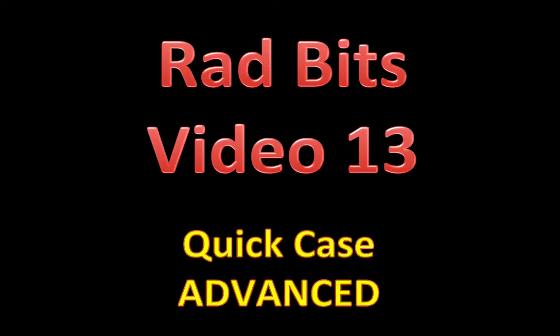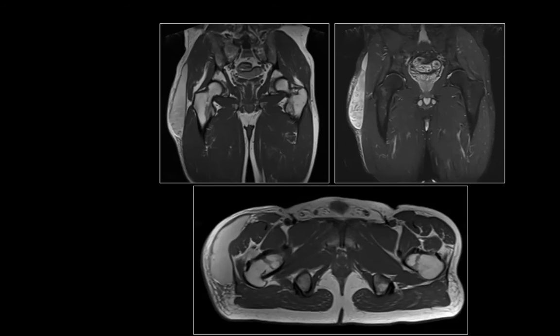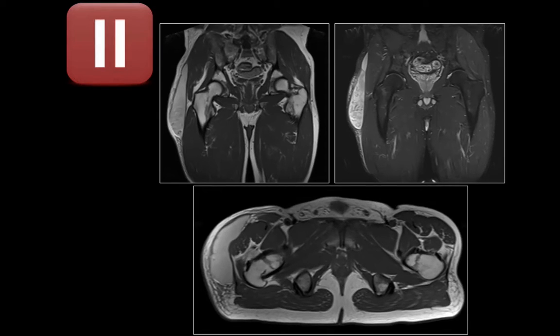Today's case is an advanced musculoskeletal case. As we're used to, when you see this sign, please pause to take your time in thinking about the images. This is an adult male patient. The history is withheld. Pause here.